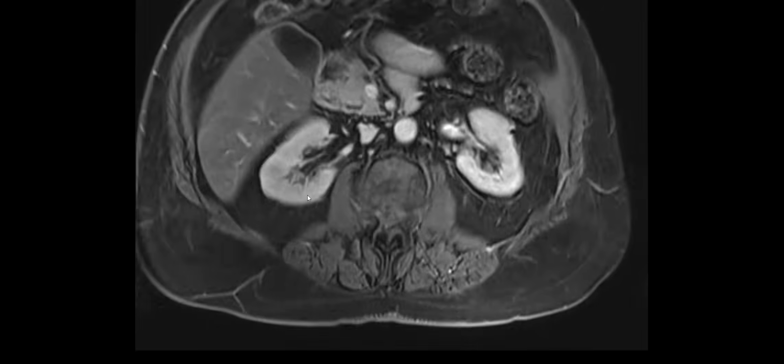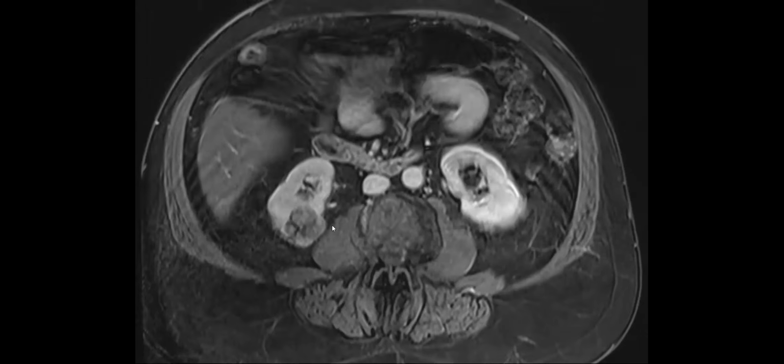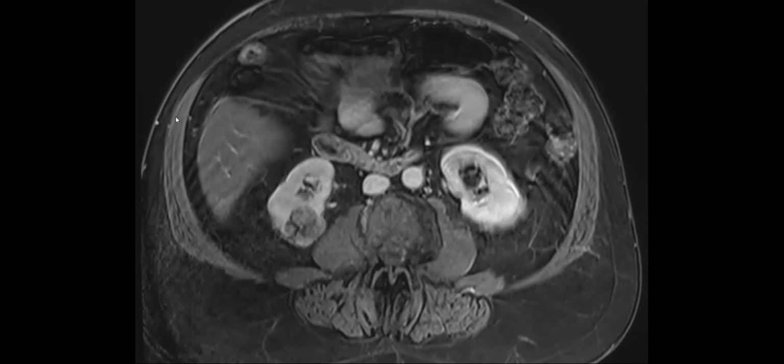Yeah. So I don't give a nephrometry score, but I always basically describe exactly that, within all of those factors: how close is it to the collecting system, how endophytic versus exophytic, like you said, interpolar, anterior, posterior, and then hanging off the poles. So yeah, this is an example of that.